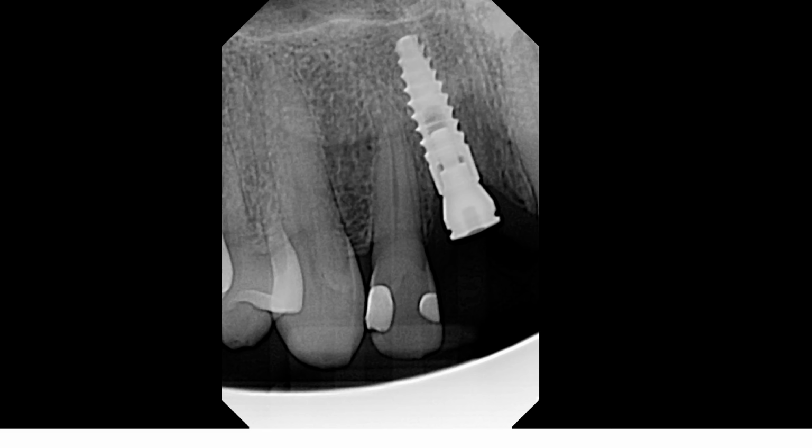Today I would like to talk about this case that I saw last week. So here what you're seeing is a periapical radiograph of tooth number 6, 7, and implant number 8. And what I'm most concerned about is the angulation or the location of implant number 8.